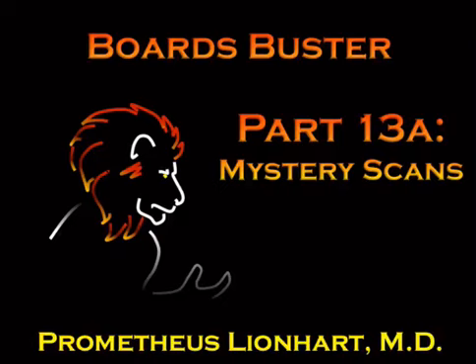All right, so this is a nuclear medicine talk on mystery whole body scans. It's a very important practical skill, just in case the tech brings you a study and doesn't label it or tell you what it's for, and then quits, and then gets rid of the acquisition and the patient's medical record number. And you still have to dictate the study. It's nice to be able to figure out what kind of study it is for that very practical situation.